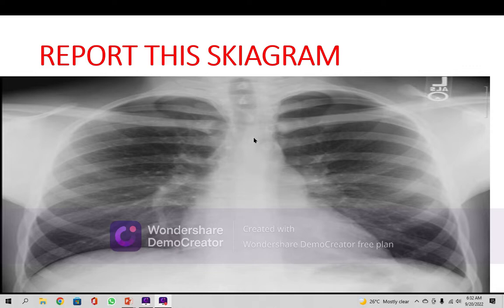So what is the reason behind it? There are many reasons behind it. He tried to be in a straight line because of two spinous processes, one is this, one is this. Make a point 1, point 2. Now make a line here. It is like this. The patient is tilted on the right side.